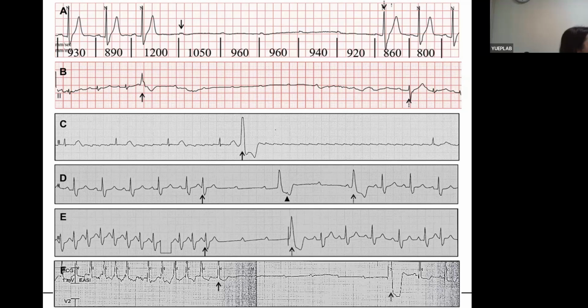Should we call it just concealment or phase 4 AV block? Perhaps it is not phase 4. That's my question. Usually the phase 4 block makes several consecutive beats of AV block at least, but it was just a single beat. So I guess it is a block. Clinically, there's a lot of PVC and a few AV blocks.